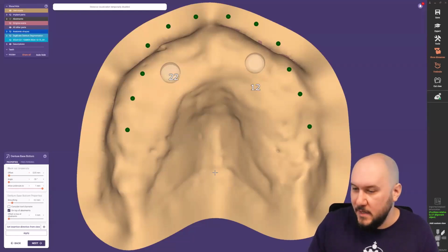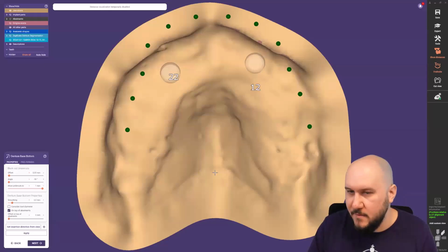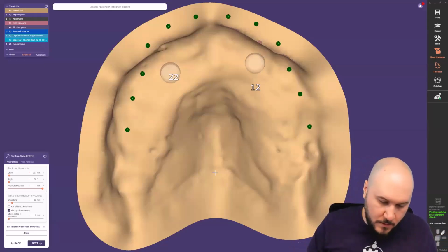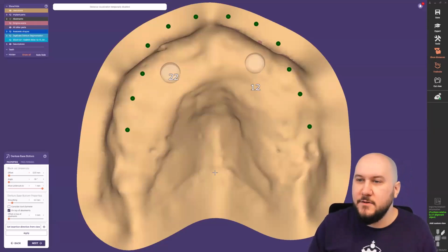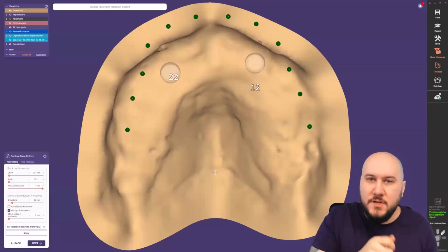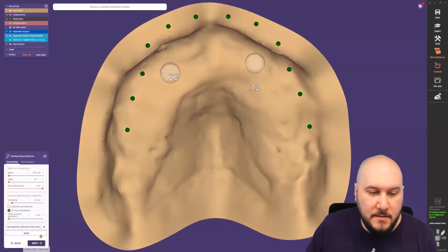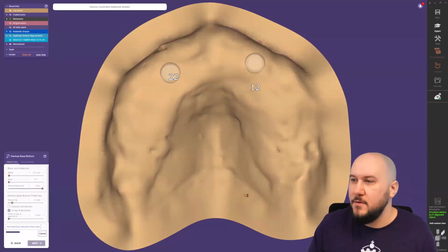And also, like you see, import the implant information files. And also with our integration of our implant library editor directly in the CAD, you don't need to download everything from our website. You just need to go into the CAD software. If you don't want to download the implants, everything will take place in the folder.